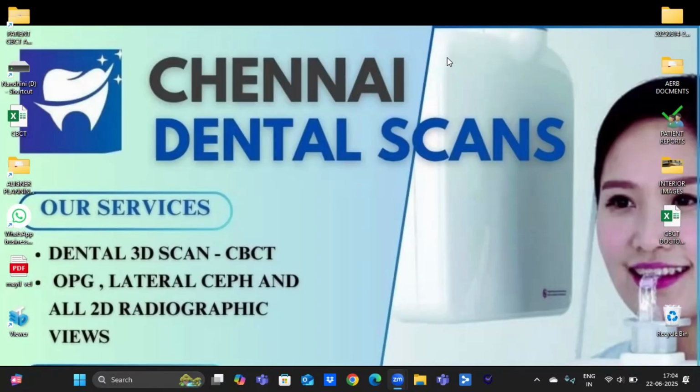Once the CBCT is taken from the center, we usually give the file or folder to the respective patients, and along with that, we'll mail it to the doctors. And in the mail, you will find a folder like this. This is a demonstration folder for today's demo. It's a patient Venkateshan. It's a full face scan we have taken.